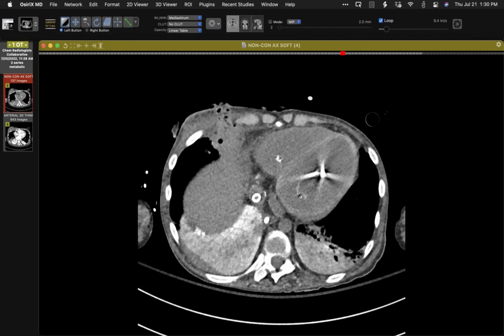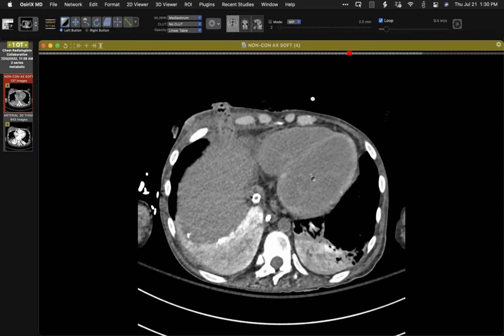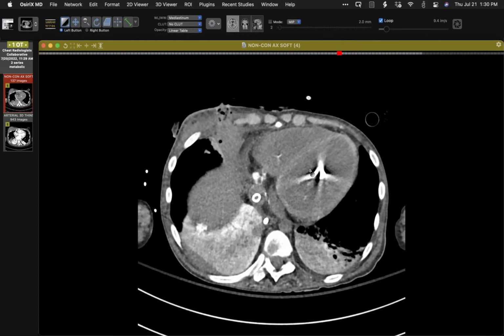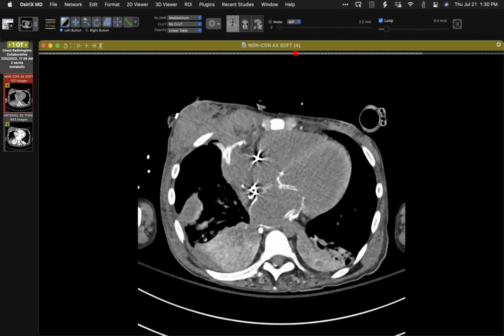It's a left ventricular vent. They know that some patients will develop left ventricular overdistension in the context of ECMO, and they will use a left ventricular vent like this to decompress that left ventricle. And the blood that's taken out via this left ventricular vent is connected with the Y connector to the venous side of the circuit for ECMO.